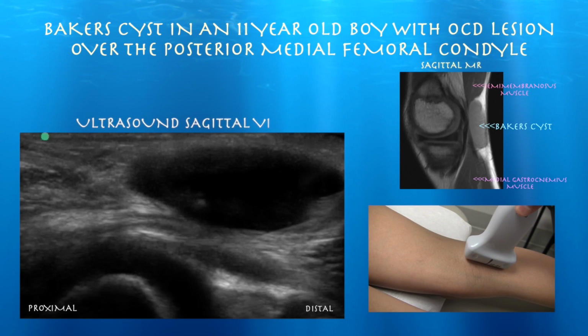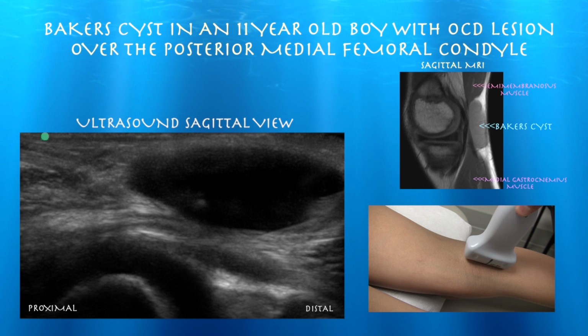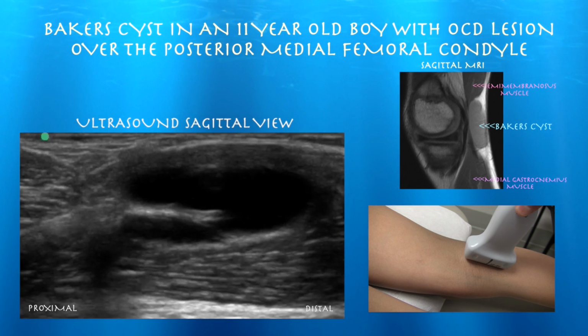Here's our sagittal view, and we can see the Baker cyst. We can see the semimembranosus muscle transitioning into the tendon, and you can appreciate how thick his hyaline cartilage is over the medial femoral condyle. And this is typical in the pediatric population. You can also see the medial gastrocnemius muscle and tendon nicely here as well.